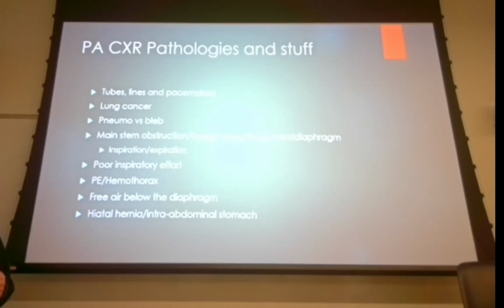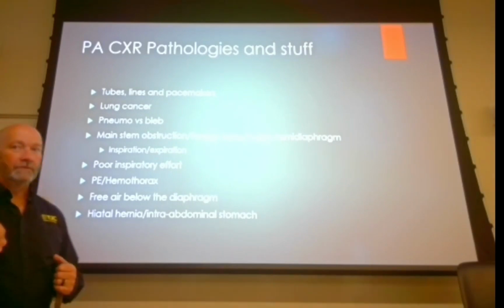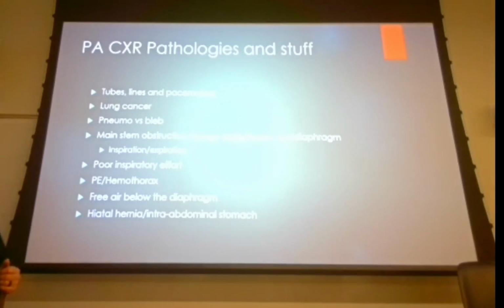And so it leaves just this light area that doesn't really look like much, in all honesty. But it's a small localized area, generally, with lung cancers. So if the patient's in bad shape and they can see the lung cancer, a little bit of positioning error is probably not going to be a big deal.